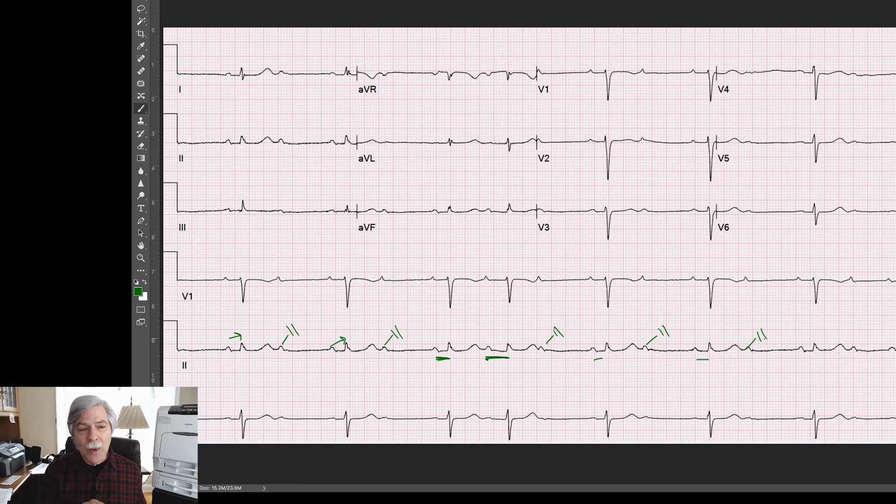Okay, that's what's cool. Now, maybe you'll get lucky and you'll see something like this on a cardiogram in the office, or maybe you have to do a Holter to catch something like this, because it's a matter of what the atrial rate is. As the atrial rate slows down, you might see more of this because the AV node doesn't get blocked up as much. The faster the atrial rate is, the more likely the AV node will block. Everybody get that?